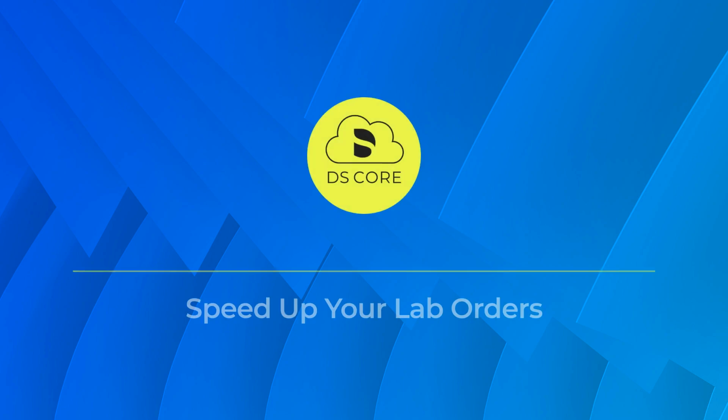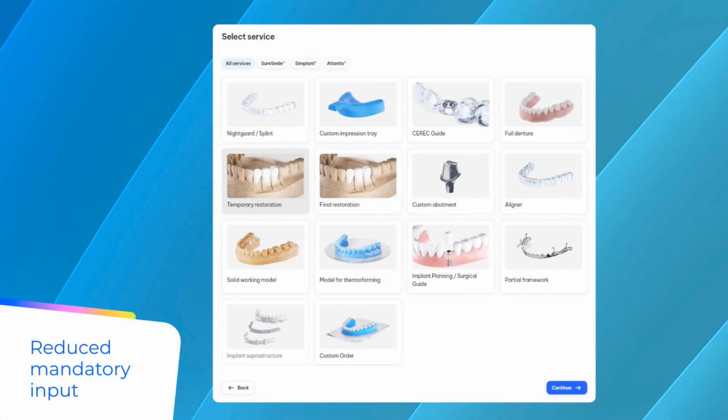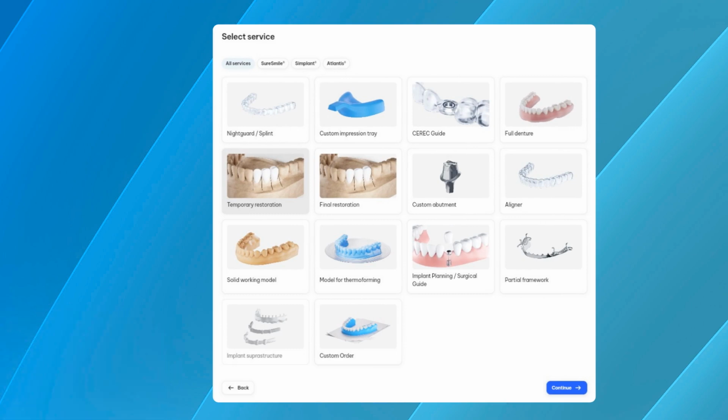The following tutorial describes how to speed up your lab orders process through less required input. Let's begin. With this release, we've significantly reduced the number of mandatory fields, making the steps to fill out the ordering template faster and more intuitive.